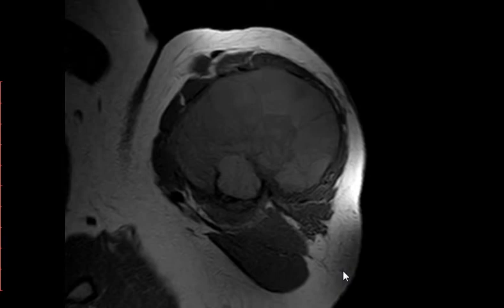It is expansile, and giant cell tumor is in the subarticular area, not the subcortical. Aneurysmal bone cyst can arise anywhere. It even arises in other lesions. You can have a giant cell tumor and an aneurysmal bone cyst arising within it. Secondary. Okay? Look, giant cell tumor and then within it an aneurysmal bone cyst. Okay?